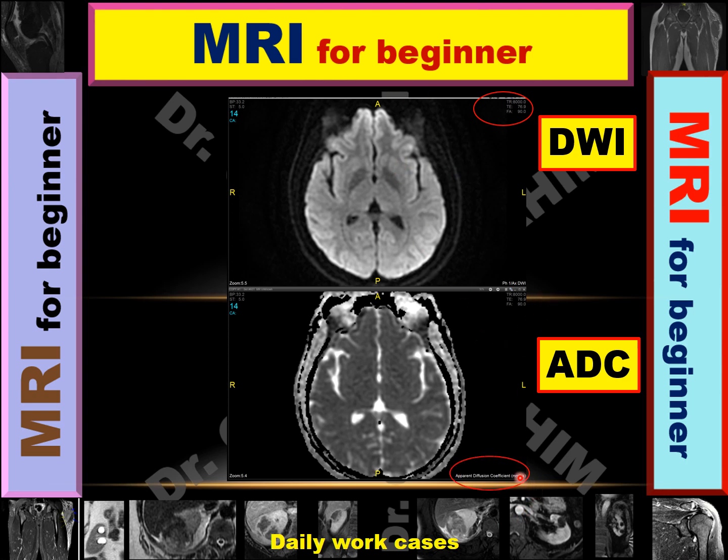Also, the study name can be written at the bottom of the image if you examine it on your workstation. However, we define the image by other findings like CSF, white matter, hazy outlines, and the drawing appearance.